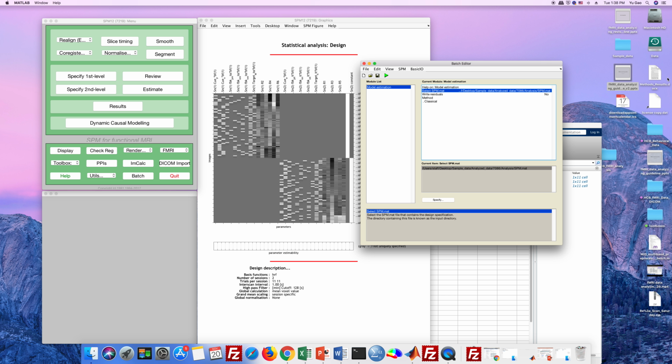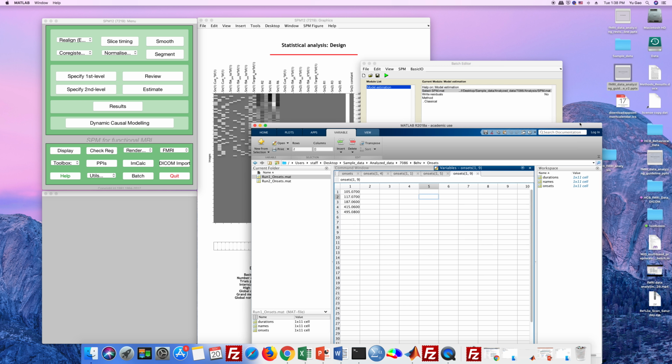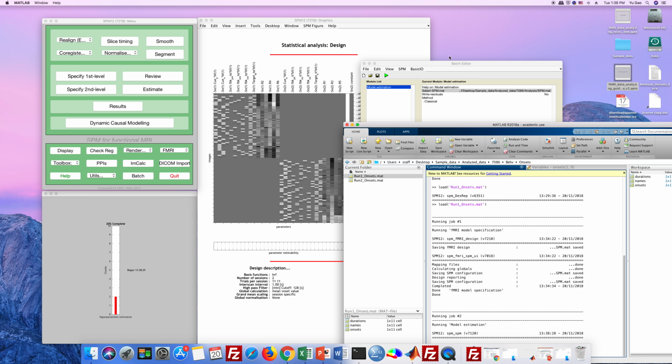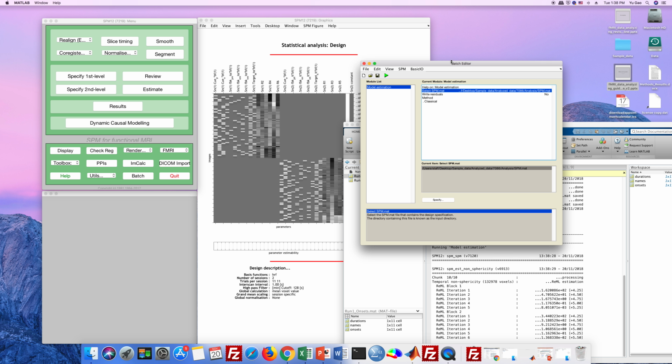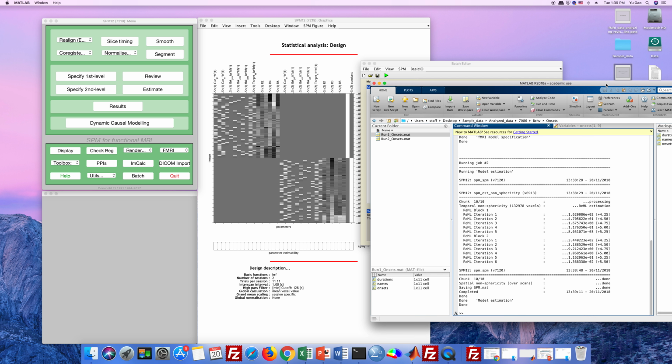Done, and press run. Okay, so it's running. Okay, it's done.